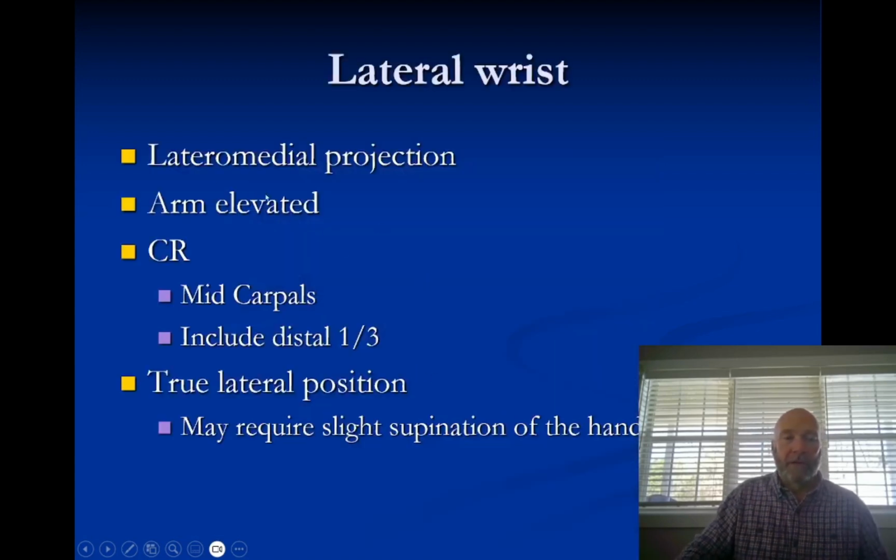So lateral, again, we want everything in the same plane. We want true lateral position.